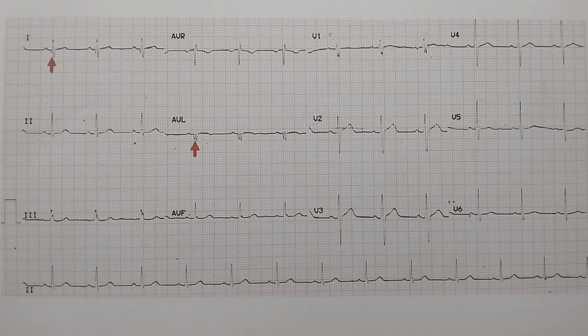This is a high lateral myocardial infarction, but the findings are very subtle and difficult to diagnose with this ECG alone unless you have other evidence like typical chest pain, enzyme elevation, probably wall motion abnormalities on echo. And this ECG also gives another finding which is of relatively recent description. We know that ECG was started how long back? 125 years nearly, 1.25 century back. But acute myocardial infarction diagnosis did not come at that time. ECG diagnosis of acute myocardial infarction was only later on.